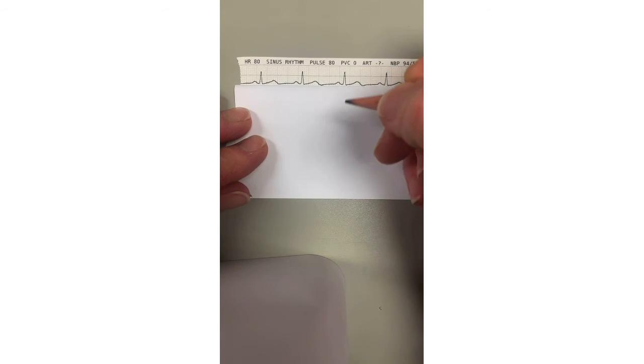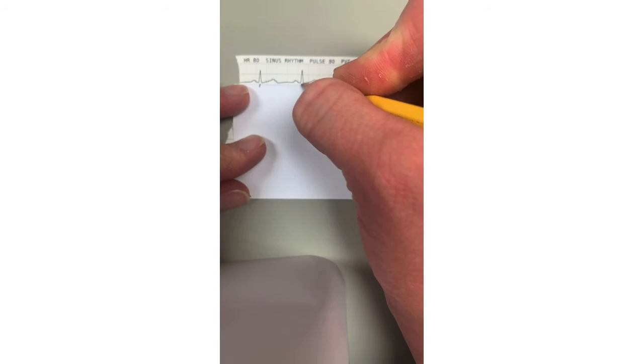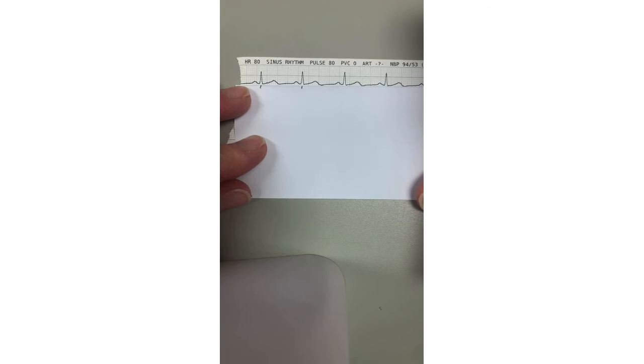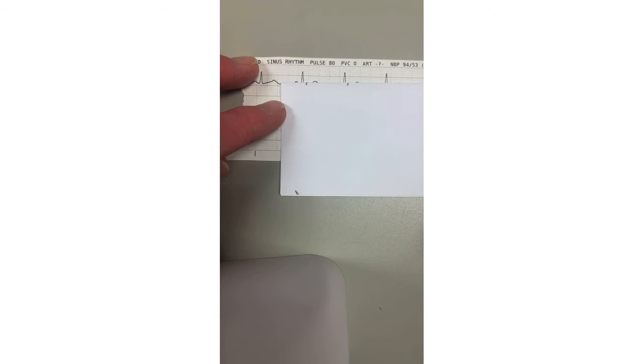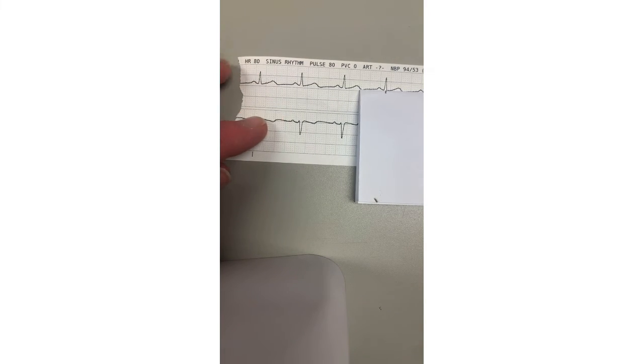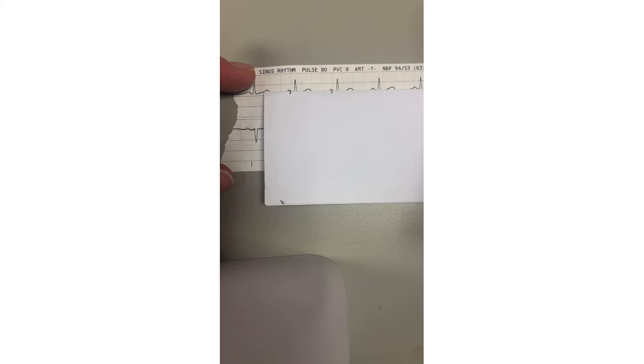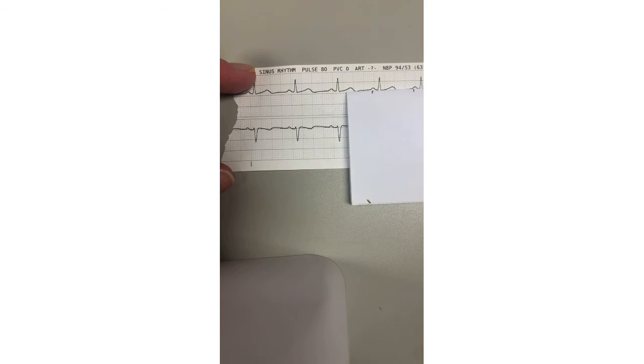After we look at our patient's rate, we want to look at their rhythm and is it regular. We can see if it's regular by marching out the QRS complexes. You go down your strip and you see that they all line up. And they do. You can do the same thing with the P waves. Put a hash mark in the center of your P's and move it down your strip and see that they all line up.